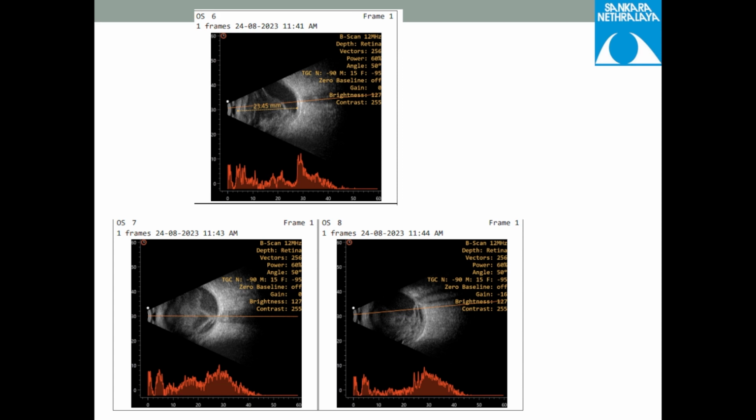0.5, 0.7, 1 millimeter, depending on the location. Correct. So roughly around 500 microns is the whole thickness of this ocular coat. So unless they detach from each other, you cannot make them out separately. And that's the reason why I said retinochoroidal.